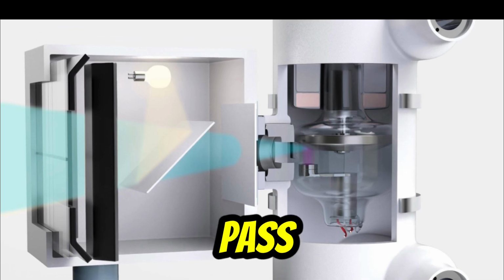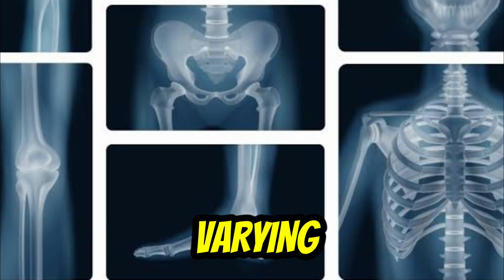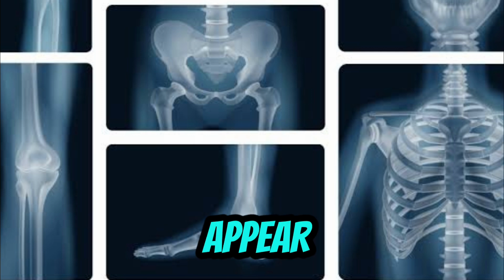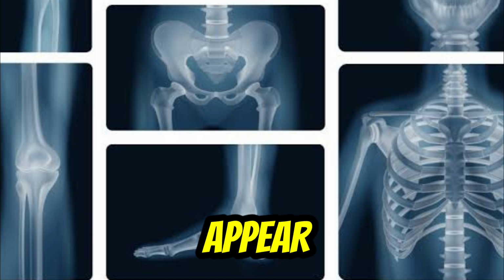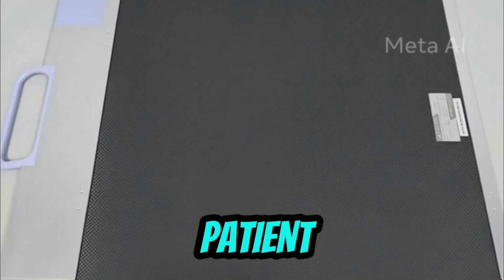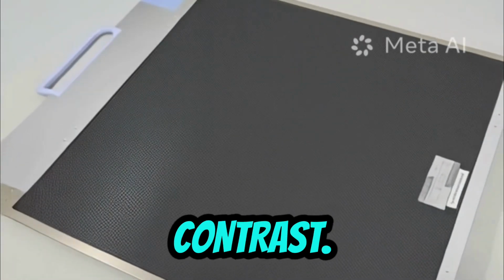The X-rays then pass through the patient's body. Different tissues absorb X-rays to varying degrees. Dense structures such as bones absorb more X-rays and appear white on the image, while soft tissues absorb fewer X-rays and appear in shades of gray. A grid is often positioned between the patient and the detector to absorb scattered radiation and improve image contrast.